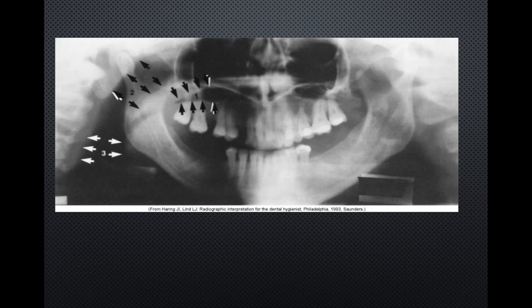Before we talk more about the normal anatomy, you also need to know that you can actually see air spaces on panoramic radiographs as well. This is important to be aware of because whenever we see dark or radiolucent areas, we initially think, is this pathosis? However, sometimes it's not pathosis, it's just the appearance of the panoramic due to air spaces. These are completely normal things to happen, so it's just important to know that they exist. The 3 air spaces you need to know about are the palatoglossal airspace, nasopharyngeal airspace, and glossopharyngeal airspace.